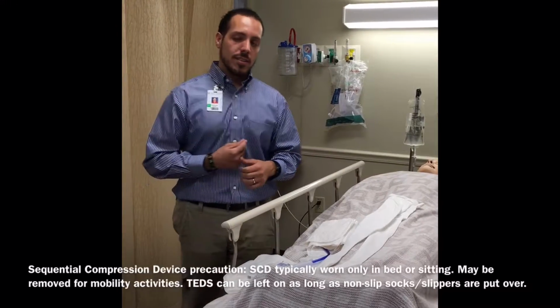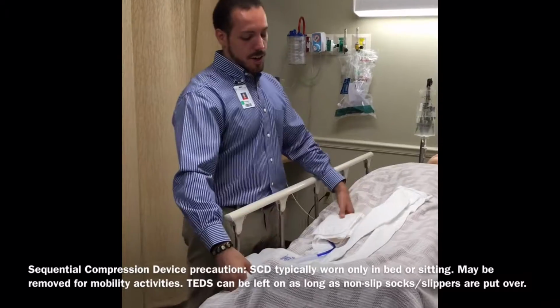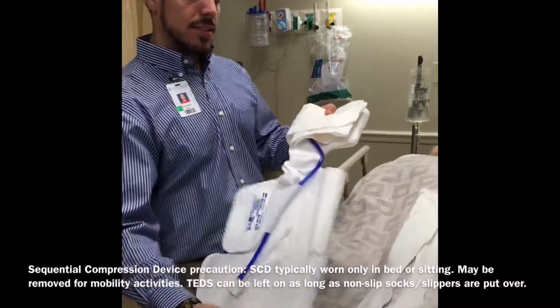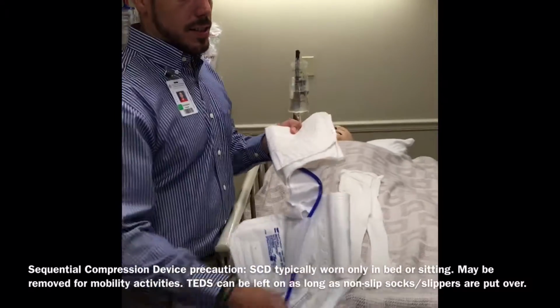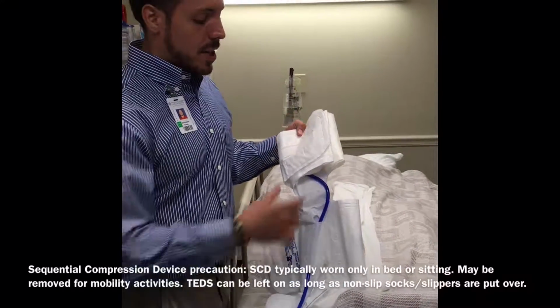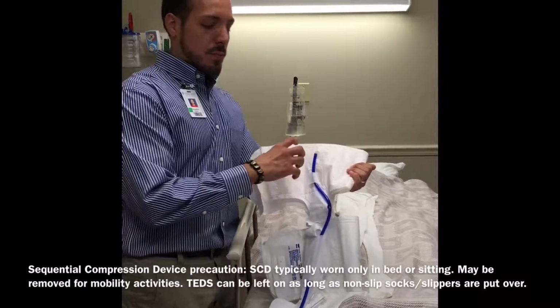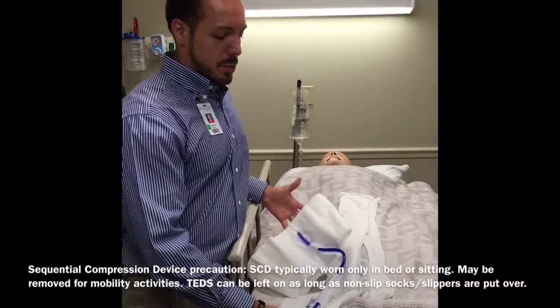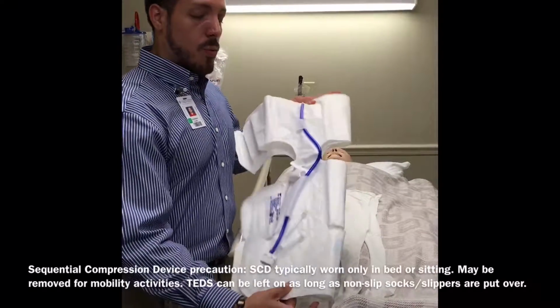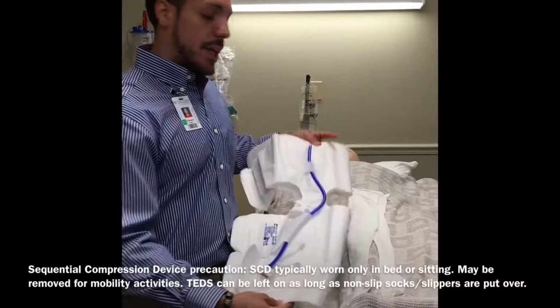So our next two devices that we're going to talk about are SCDs and TEDs. SCD right here being sequential compression devices. So you're typically going to see these on your patient's legs hooked up to an air pump right on the hospital bed itself. And what it does is sequentially compress the legs, and that's for the prevention of thrombosis. You don't want to ambulate your patients with this. So they're in the bed, you're about to ambulate, you can take them off.